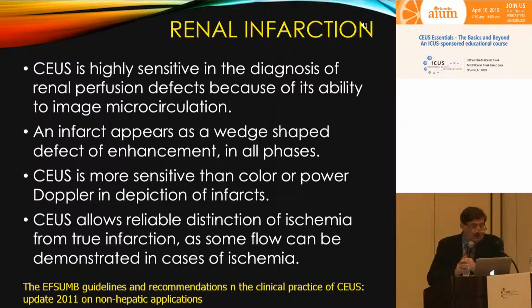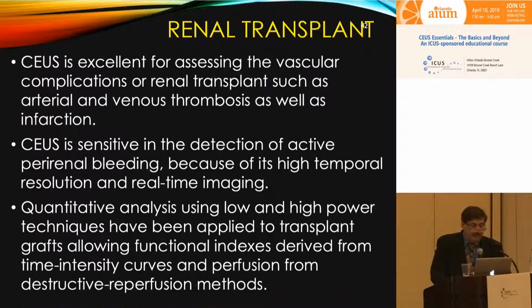Renal infarction. CEUS has high sensitivity in the diagnosis of renal perfusion defects because of its ability to image the microcirculation. An infarct appears as a wedge-shaped defect of enhancement in all phases. CEUS is more sensitive than color or power Doppler in depicting infarcts, and CEUS allows reliable distinction of ischemia from true infarction, as some flow can be demonstrated in cases of ischemia.